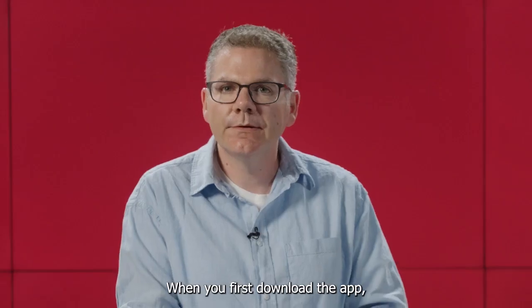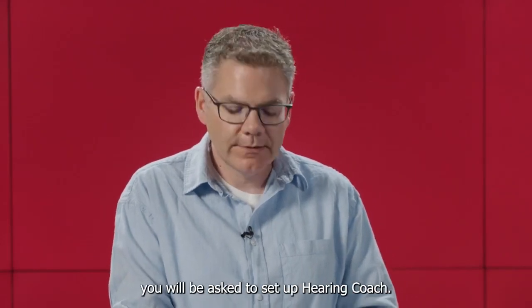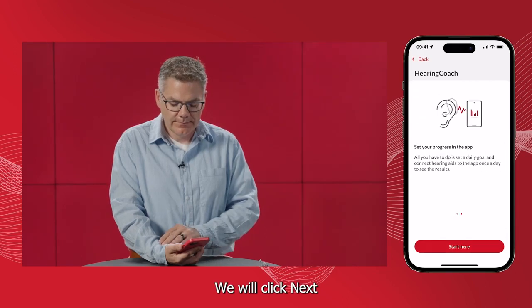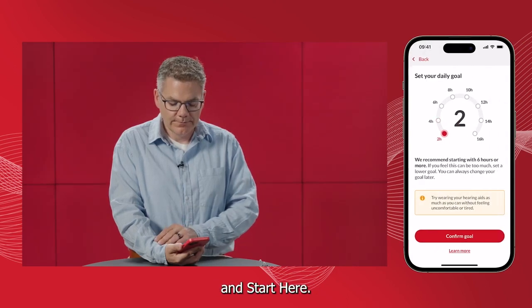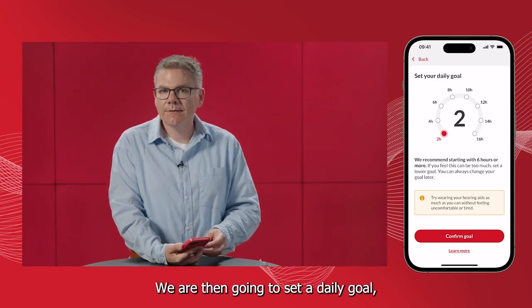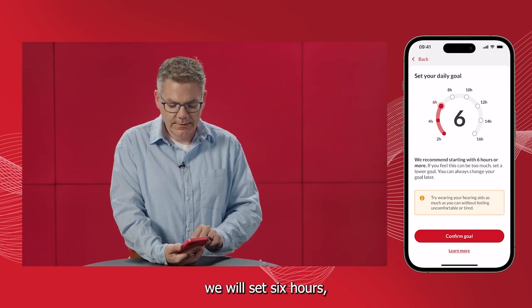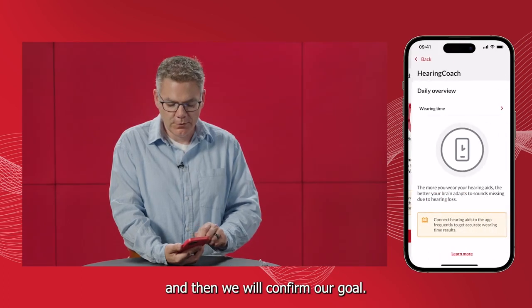When you first download the app, you will be asked to set up Hearing Coach. We will click Next and start here. We are then going to set a daily goal. And we'll set 6 hours. And then we will confirm our goal.